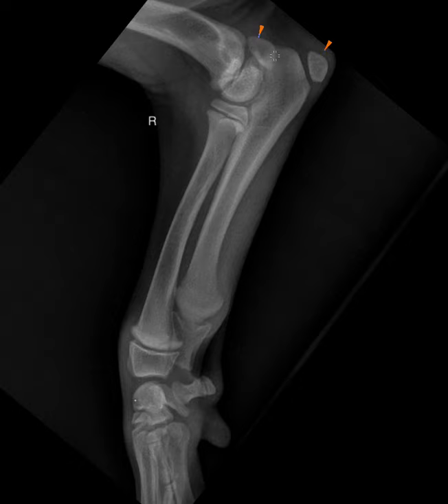This guy here is a bit trickier, okay? This ossification is representative of the medial epicondyle of the humerus. So this is actually part of the humerus. And you'll recall, and we'll talk about later, when we flex the elbow in our dogs where we're screening for elbow dysplasia, so an older dog, this medial epicondyle is what we're trying to get out of the way so we can see more of the ulna.